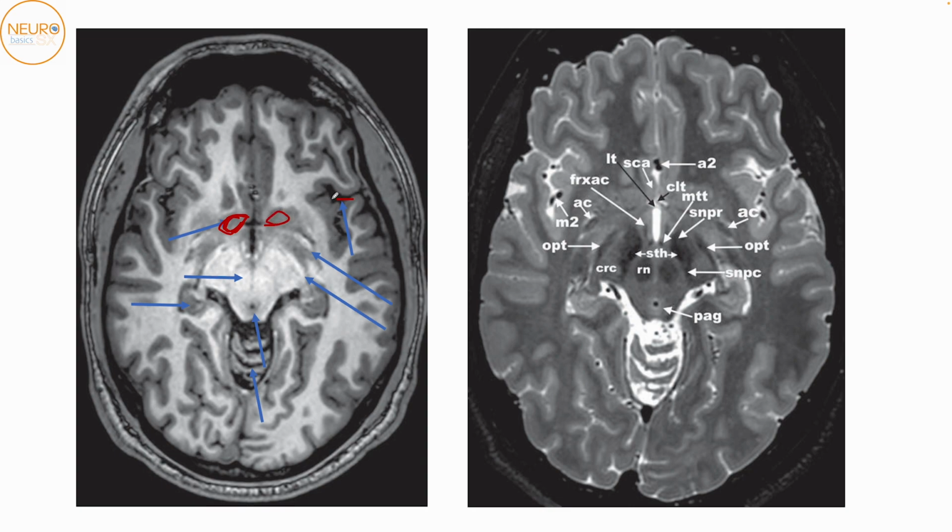Okay, so here we can make out the Sylvian fissure. This is all frontal lobe, gyrus rectus, your olfactory gyri, all temporal lobe, and your occipital lobe. This is the midbrain that we have made out. This is the aqueduct over here with the periaqueductal gray. This will still be at the level of the superior colliculus. This here is the nucleus accumbens.